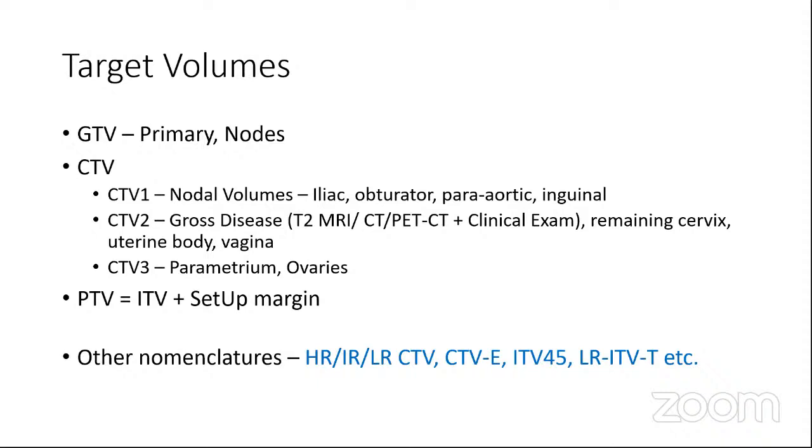That's the problem with the fundus of the uterus. But we cannot give a large margin like that for the ITV. So the PGI article says we can deliver around 1.5 centimeter expansion around the fundus of the uterus. A superior-inferior margin as well as an anterior-posterior margin of 1.5 centimeter is suggested.